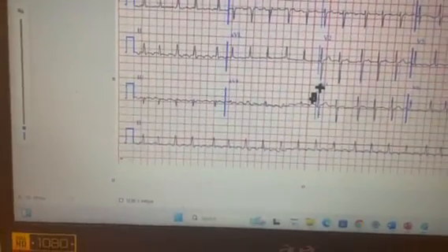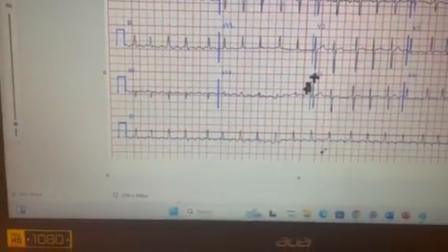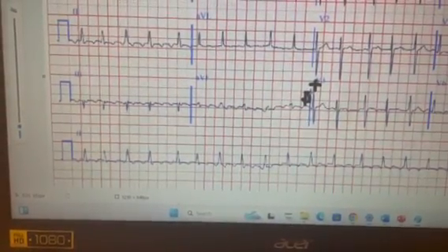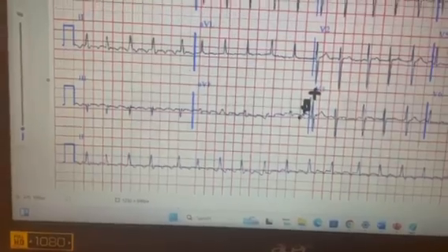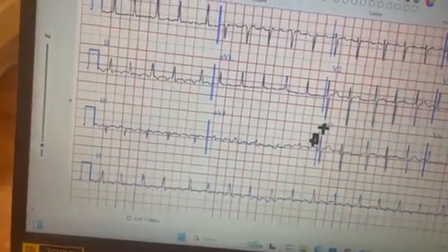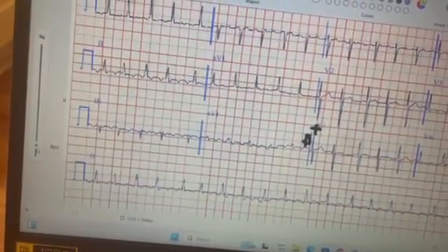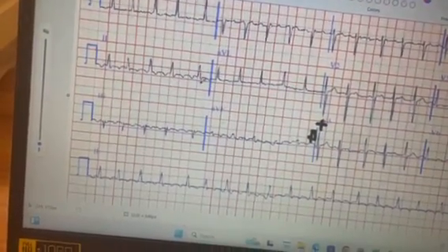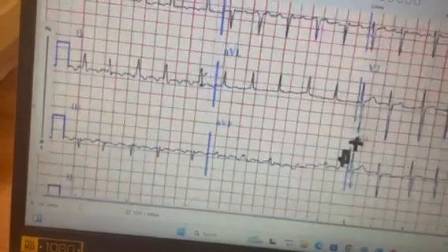So pretty much we're only looking at this bottom part. A couple things to know, I kind of drew it over here. And by the way, I'm not a really good artist. I'm going to really try to make this clear, but I would not put your faith in me. I'm just going to sketch it over here.